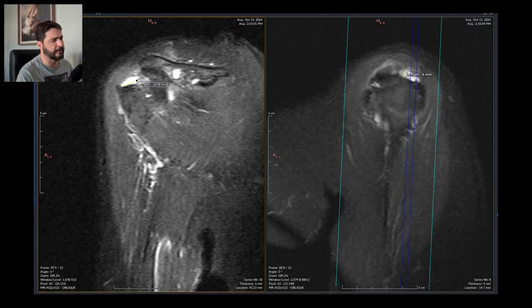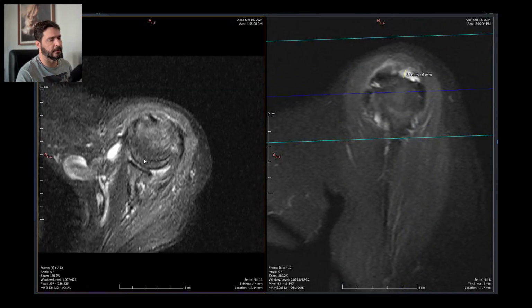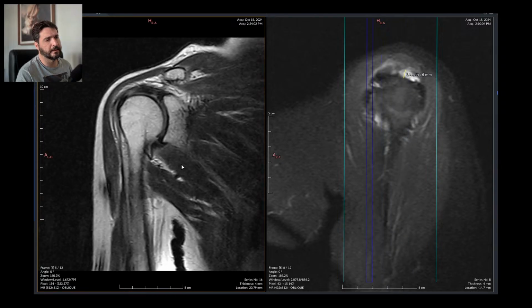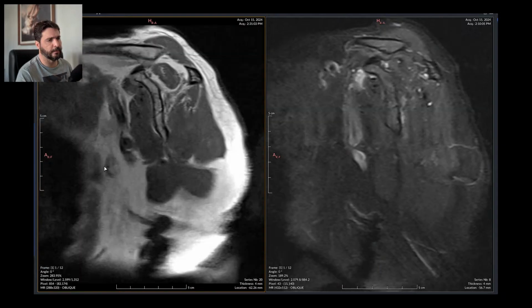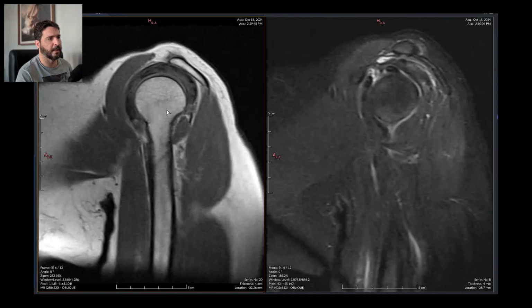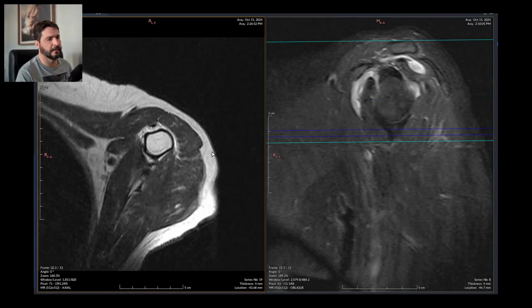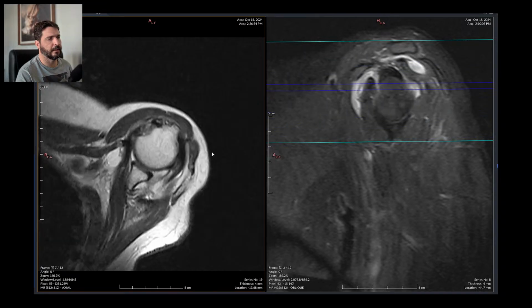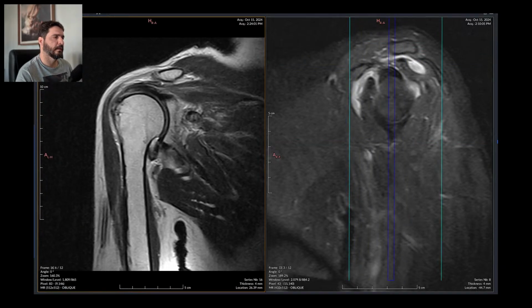So let's grab a T1. The patient shook a lot on the axial sequence, so the technician repeated it a bunch of times. This is clearly not a T1. This is probably just a PD without fat saturation, which by itself makes no sense. This is a T1 because I can see liquid right here and it's black. Let's see if this is also a T1. Is this a T1? I guess it is. No liquid is shining, so there is no. And see, let's just compare.